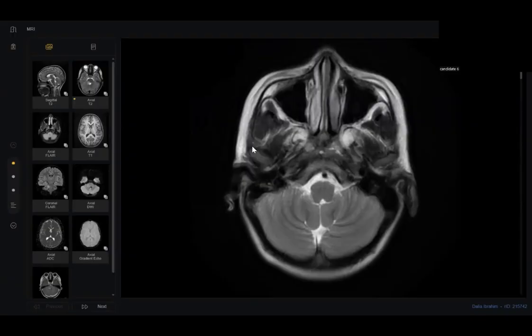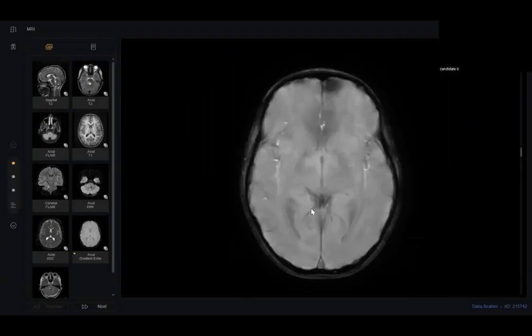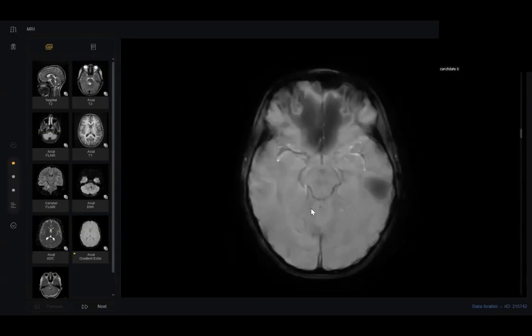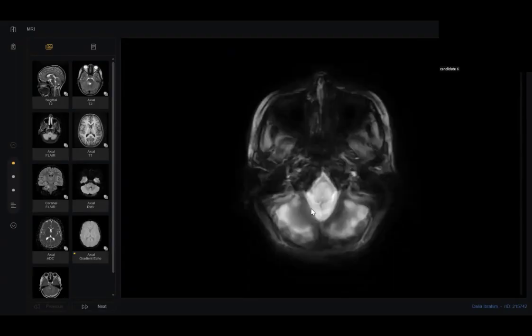Thank you. Do you know why you didn't pick up that this is the tuberculoma? Which sequence you didn't ask or look at all? The only sequence that you didn't ask, it was the key sequence for tuberculoma.